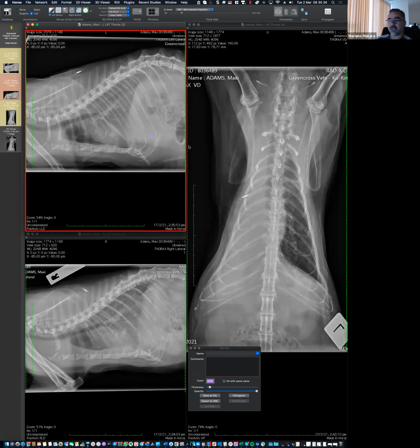The strongest feature from what you said, you were arguing against this being edema, I think. And the stronger argument in my eyes is not so much that you don't see air bronchograms, which I agree is there, but I'm insisting that it's not necessary, but the asymmetry. It would be very unusual to have such an asymmetric distribution, and also a hemithorax distribution.